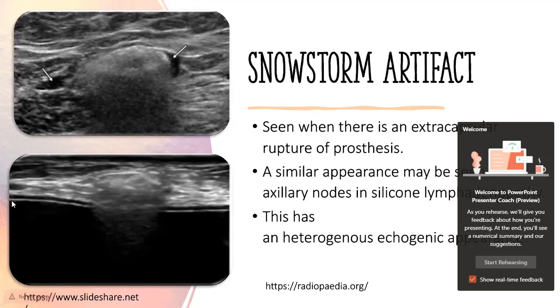On the bottom picture, we've got the silicone implants. We've got a break in the implant with our snowstorm appearance.